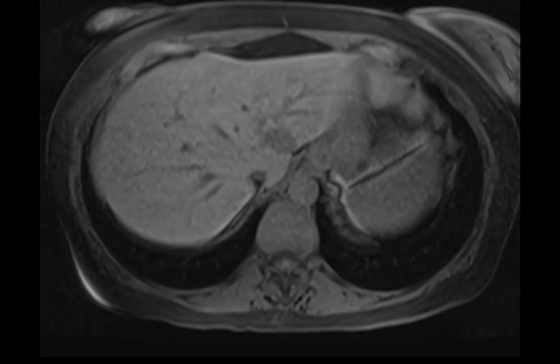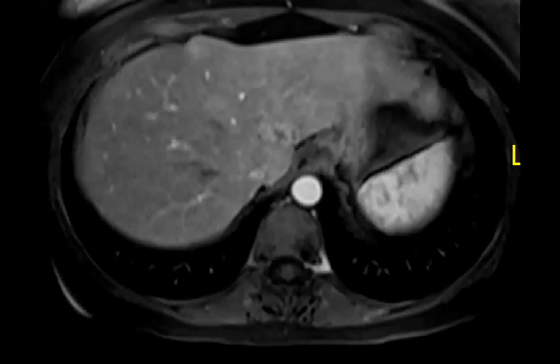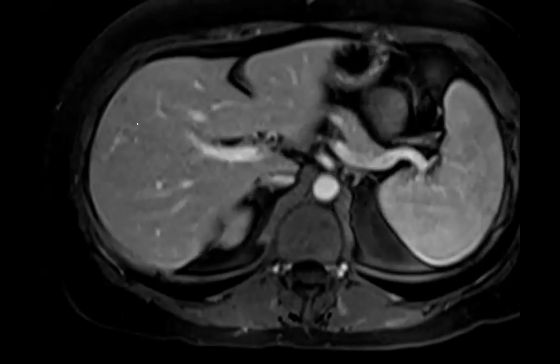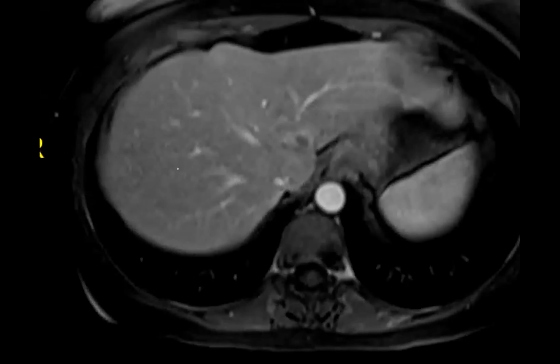Again, I think this, at best, could be called a sort of atypical hemangioma. The bigger ones, the little ones are surely not, like they don't enhance like hemangioma. Look, this one has sort of like a rim enhancement, and it just kind of becomes less enhanced later on. So it doesn't go for hemangioma. This is a hard case. Anyway, it is a hard case. A very hard case. Cystic neuroendocrine tumor of the liver is hard.